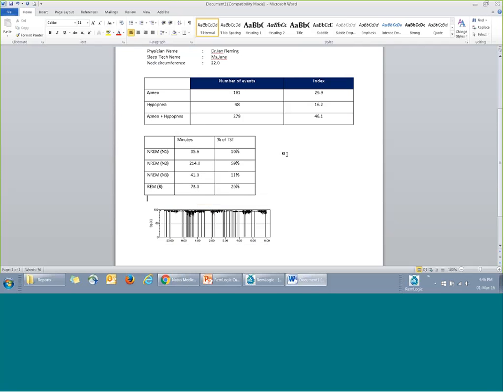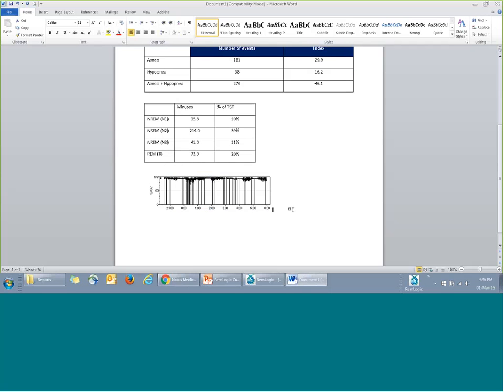Oh, I got a question. Is it possible to calculate RDI with RERA and non-RERA events? Yes, you can actually use the calculator to customize the one that you wanted to see. Let me see if I have the example here. RDI with RERA. So for Carlos, maybe you can email me on this one, then I'll show you the steps on doing this.